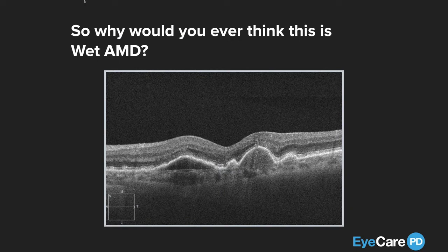It sort of makes me wonder, though, why would anyone ever think that this OCT image is wet age-related macular degeneration? Well, there's probably several reasons why people might actually think that, but we're going to go through some findings today that I hope will help you be able to prevent this as a stumbling block and catapult you to some new skills.